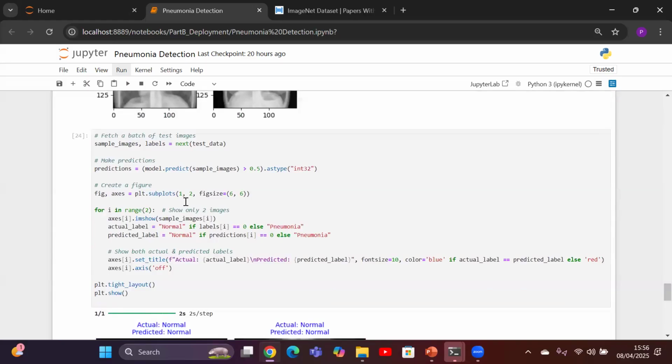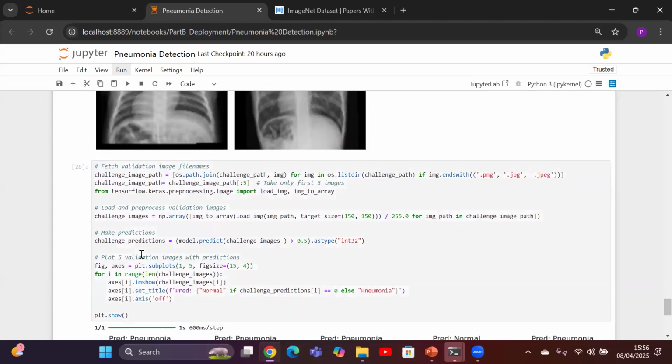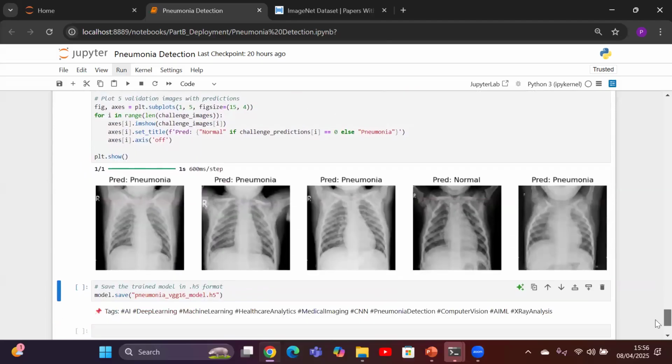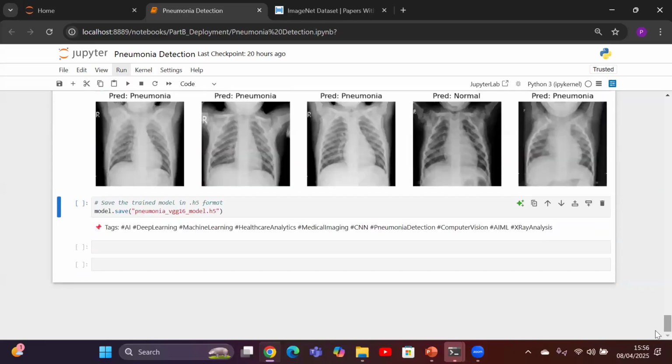We have done the scripting like this, very simple scripting using Python. I wanted to load another few images, maybe 5 to 10, keeping a threshold of 0.5. We are giving all the pre-processing. I just wanted to wait and see how it recognizes a series of images. I can see the predictions: pneumonia, pneumonia, normal, both are there.